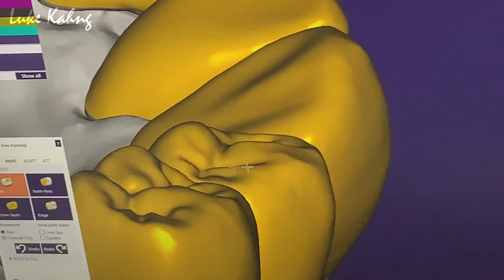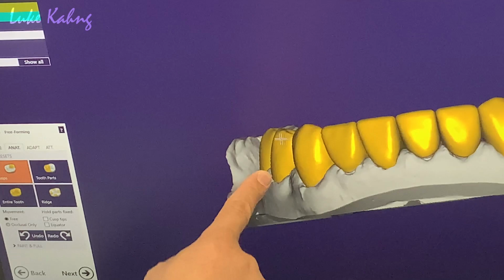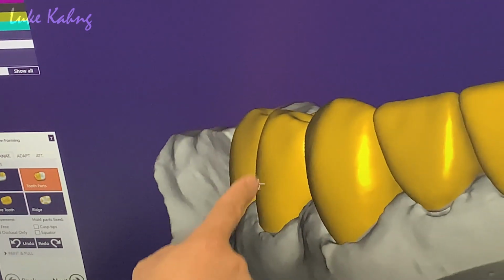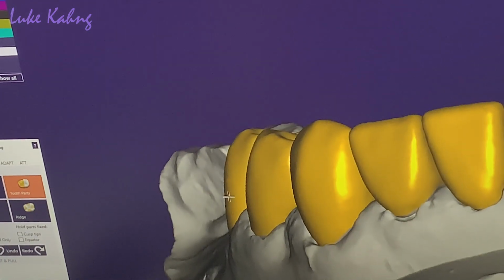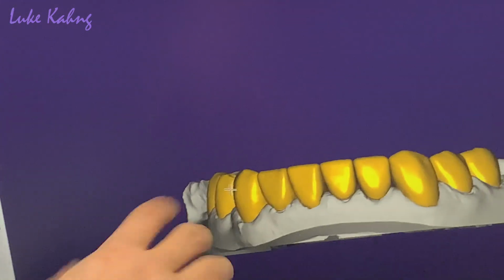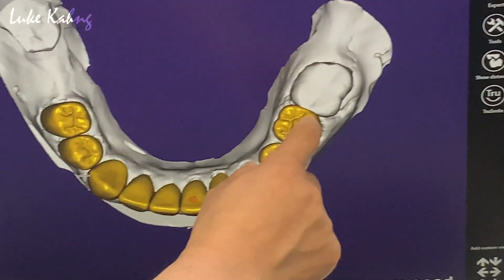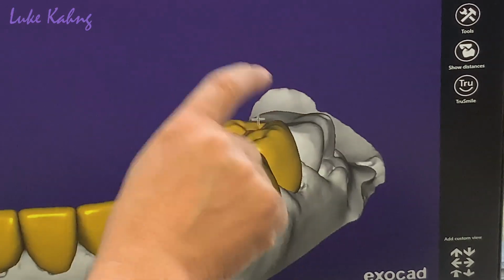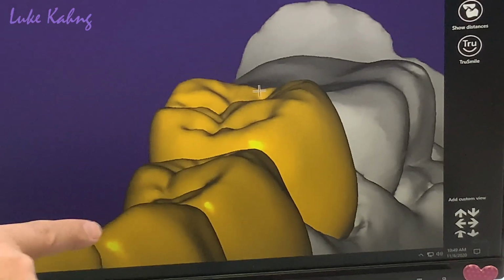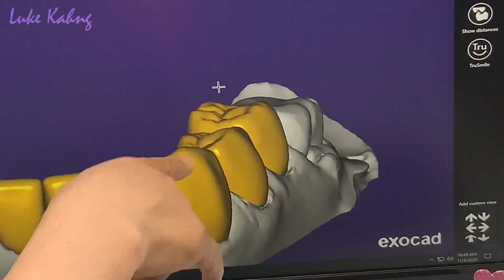It doesn't matter for occlusion because we're going to do the upper. We have to make it slightly out facially. Core, height enough, that's good. Higher. Now, same. Everything's good. Now, when you see the occlusion view, this is the marginal ridge which is higher than the other side. So you could make the distal area lower, it's okay. Distal, yes. Better. I like the occlusion anatomy.